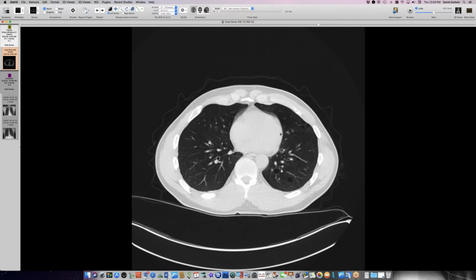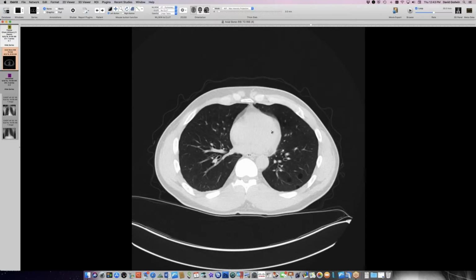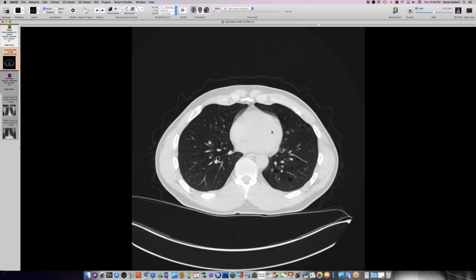Can anybody help me with the differential diagnosis of cysts? I think Travis, that there was a lot of HIV in the old days, at least in San Francisco. So you might have a lot of experience with HIV. Have you seen LIP in the setting of HIV? I can't remember seeing it. I guess the only other thing would be post-infectious. Yeah, particularly with pneumocystis. Would leave behind some nice cysts.